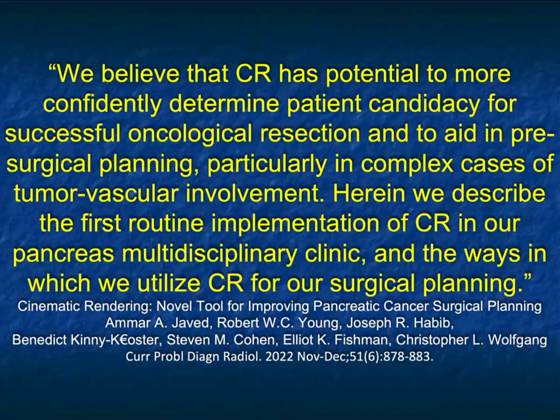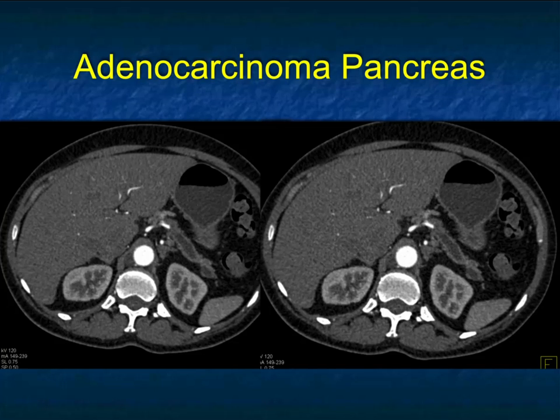We are using cinematic rendering, as this article by Mars shows, to do preoperative planning. So it's very important in detection of tumor, preoperative planning, and eventually follow-up.